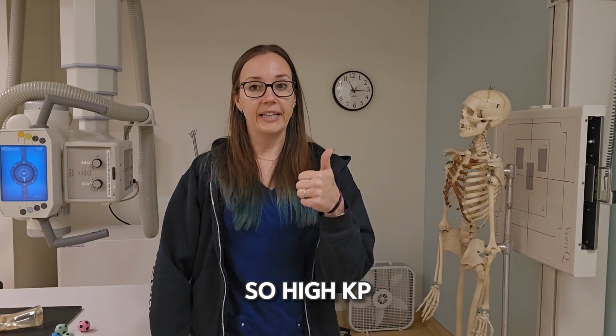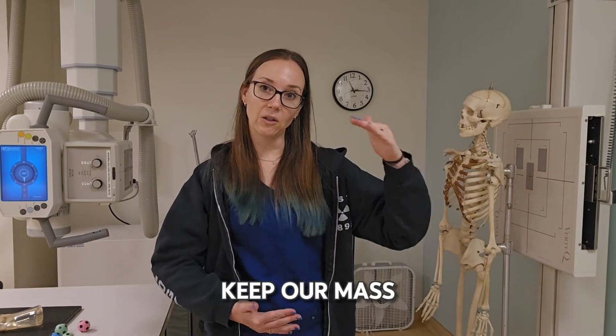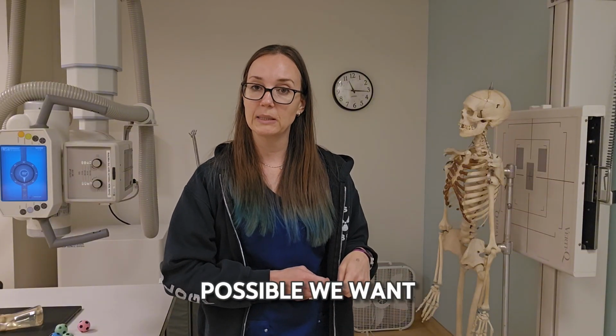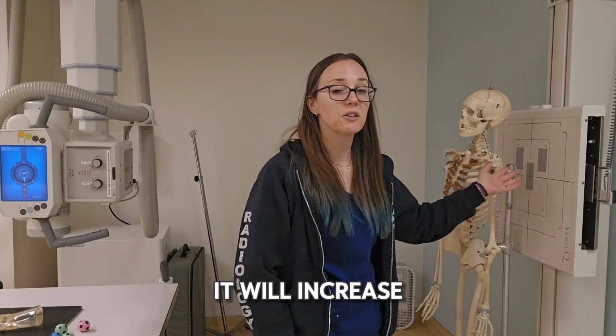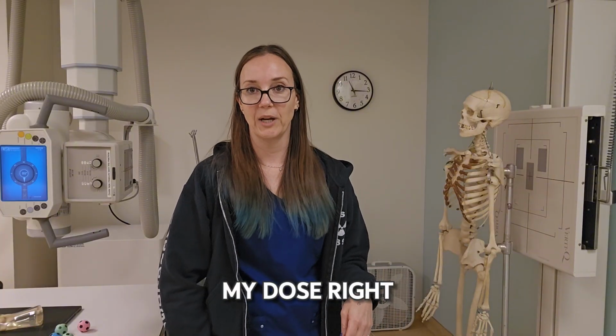So high kVp, good. Low mAs, good. We want to keep our mAs as low as possible, the number of balls we're actually chucking at the person as low as possible. We want to keep the strength as high as possible so it gives us the most grays in our image, but also it will increase our dose, but not nearly as much as like literally doubling my dose, right? I hope that helps.